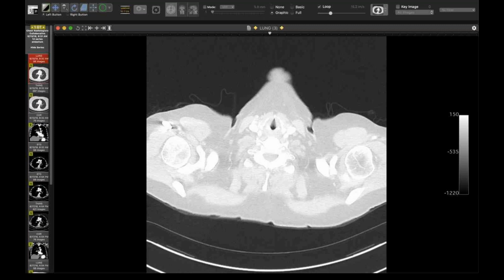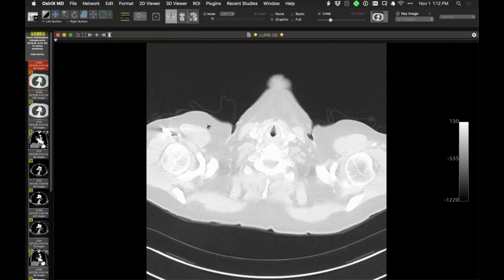I discourage that too. Sometimes you have a good 300 or 400 in the central pulmonary arteries, but you have nothing out in the periphery. It's more important to look at the homogeneity than some arbitrary cutoff. Travis, you mentioned one time, suppose it's 199. Is it non-diagnostic? Exactly. I have examples as low as 115 in the pulmonary artery, and you can still see pulmonary emboli. You could probably even go a little bit lower in the acute setting, at least. But as Seth said, it depends on the quality of the study too.